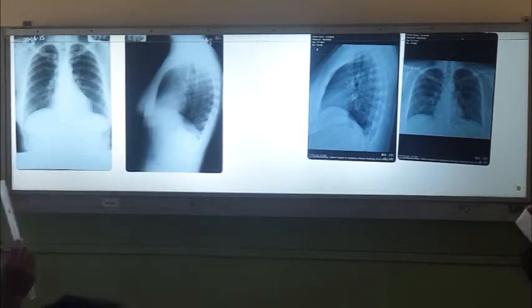If it is rotated, one lung will be darker than the other, and the hilum will be prominent. So you might think of hilum masses and all. Here we have seen enough cases like this, people suspecting a hilum mass and all. The only problem is the rotated film, right?